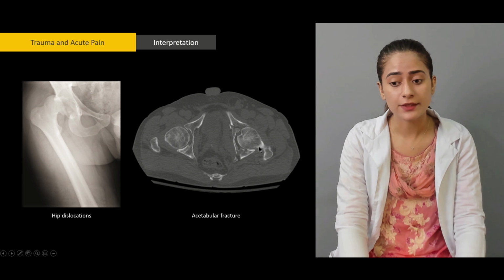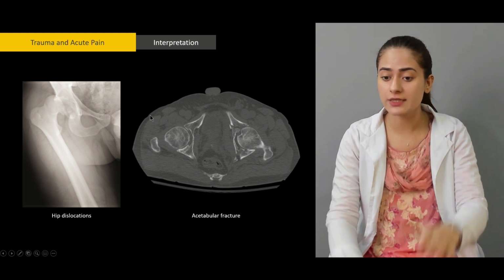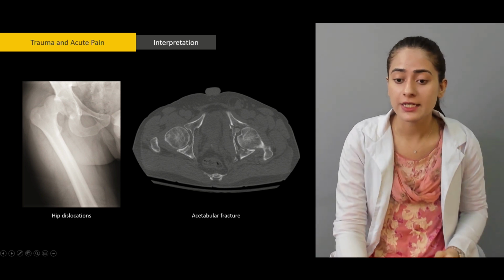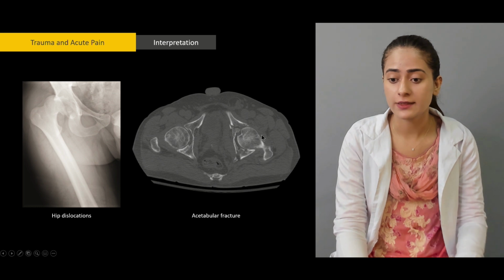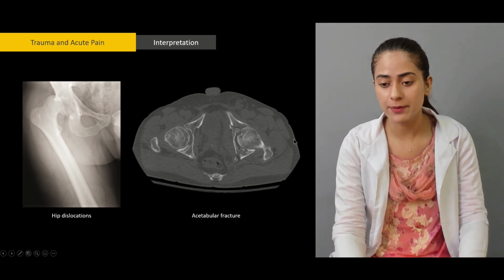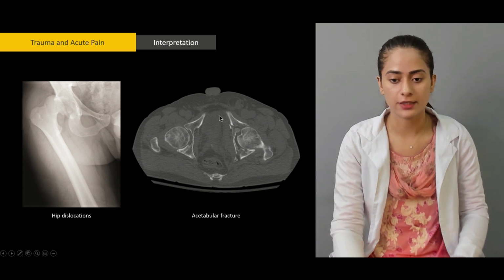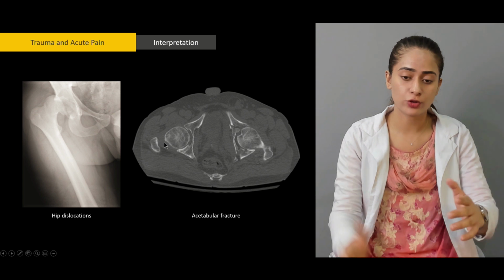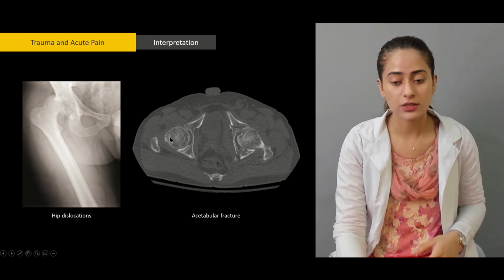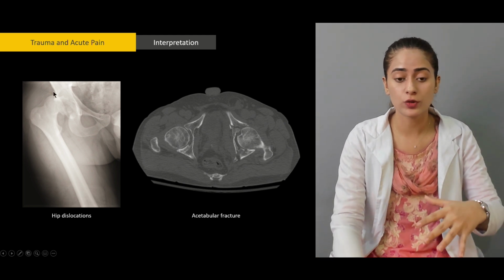Here the joint is actually visible, right? Because it has displaced superiorly, even at this cross-section the joint is visible. If you go a little bit more in depth here, you will see the entire bone connected. That should be visible a couple of slices down for normal. So this is normal, and it is not visible here because it has not moved superiorly.